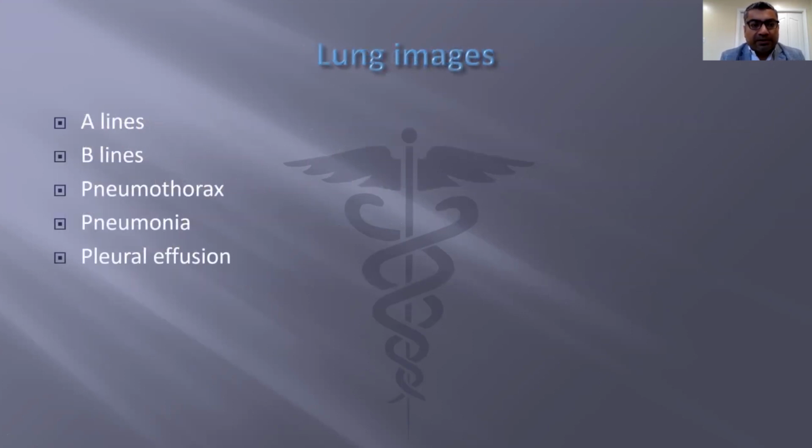Now, lung images. It was a little tough for me to understand the whole idea of lung images, but I did talk to the pulmonologist in our system who does a lot of lung images, more nowadays than before. This can help us with volume status as well. The A lines, B lines, pneumothorax, pneumonia, pleural effusion. These are the things you can diagnose on lung images.